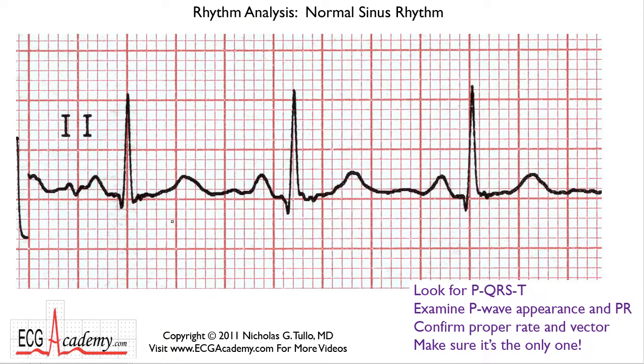Okay, so in lead 2, you can clearly see that the beats are fairly regular. You can see the QRS complex right away because that's obviously the biggest signal. So look in front of it, and that's where you should be finding P waves. And then look after it, and that's where you should be finding T waves. So if we measure the PR interval here, it's 1, 2, 3.5 small boxes. So it's about 140 milliseconds, and that's normal. The QRS complex, this is just practice for you guys, is maybe 80 milliseconds.